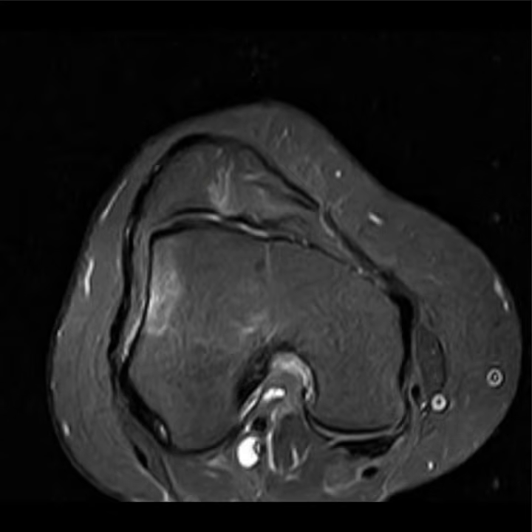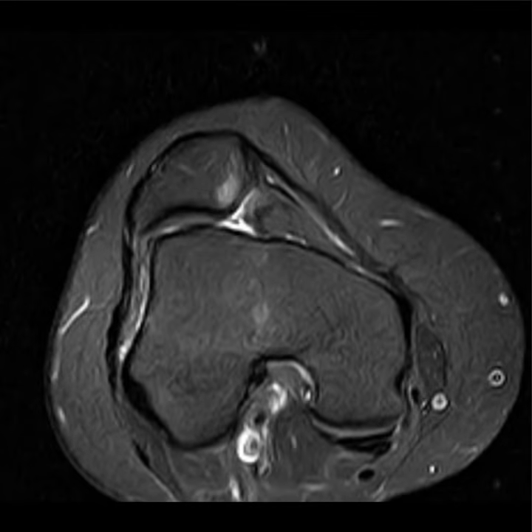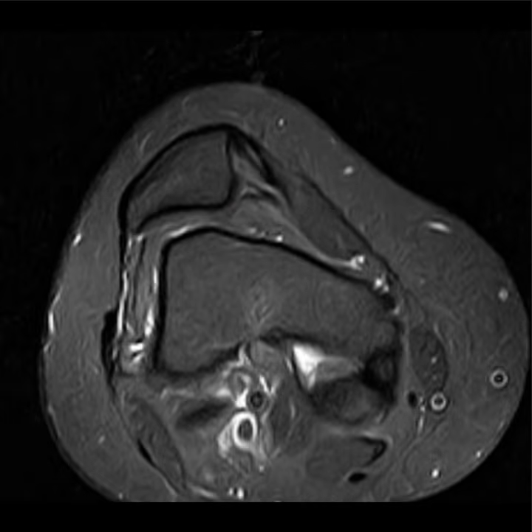Excellent, good job. What else? I can see that the medial femoral condyle is a little bit hypoplastic, and the patella is subluxed laterally. We can see that the patella is going in the lateral direction.